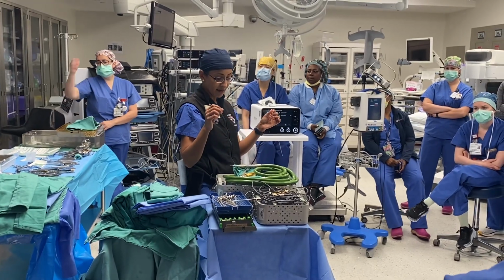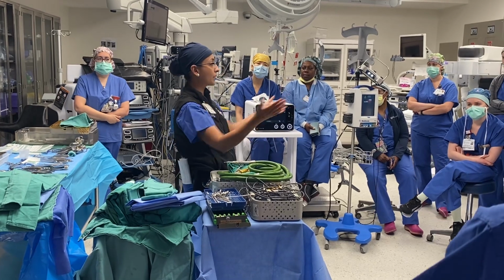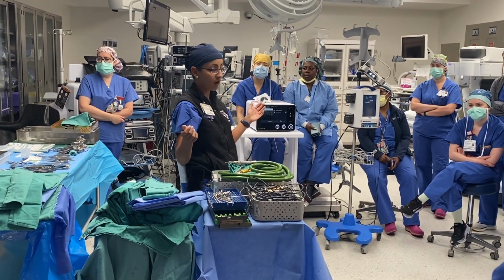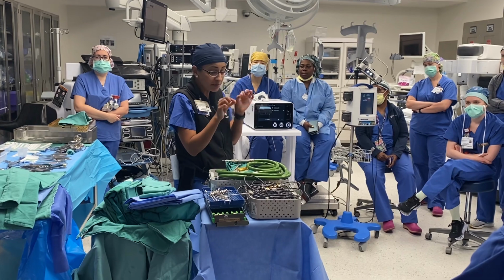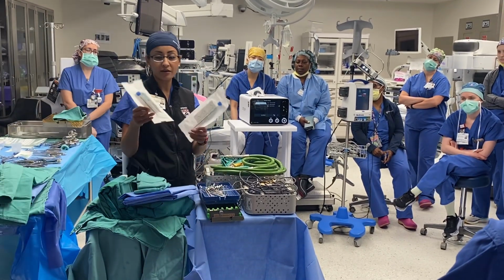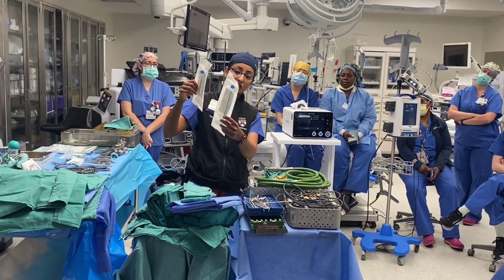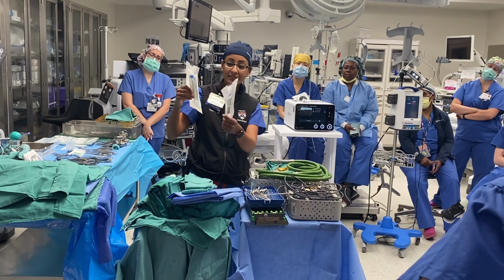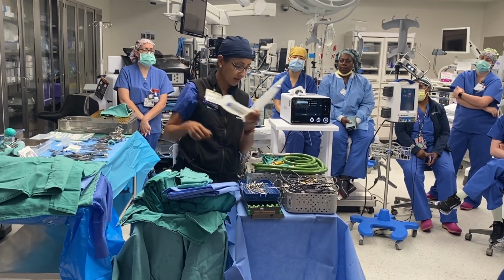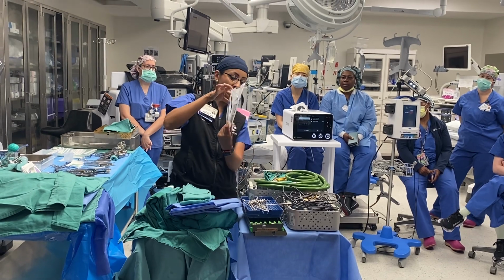M8 is the shorter one. AM8 is the longer one. AM8 you guys are used to from spine. We use that all the time in spine. But the M8, sometimes when we're at the head in these smaller areas. Of course, they've changed all the names to everything, so I don't know. But anyways, AM8 and M8, and the color of this thing matches what kind of cover you want to use it with, okay?